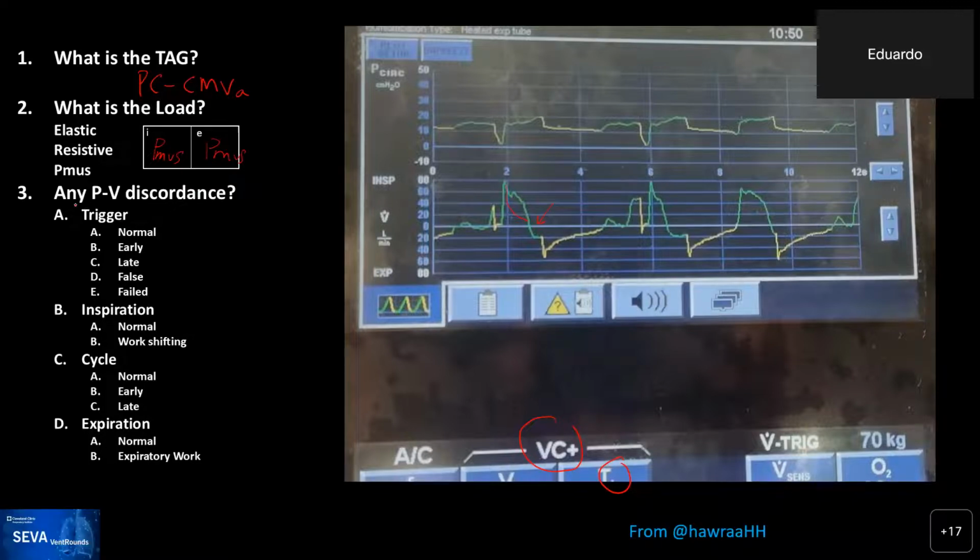And so then is the type of patient-ventilator discordance. And what you see here is a breath that seems to be triggered by the machine. So there was still expiratory flow, then it changes into a mandatory breath, but the patient actually doesn't get any flow.